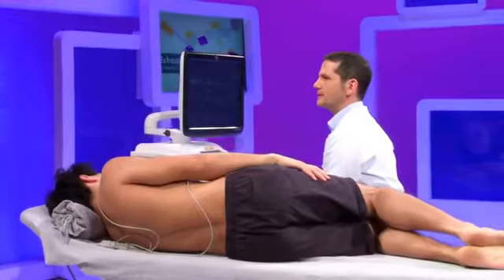I will talk to you today about the assessment of left ventricular diastolic function, a topic which is of great interest in clinical practice. The key point is that as we do not have a single parameter reliable enough to tell us everything about LV diastolic function, we need to do a comprehensive examination whereby, combining information provided by different techniques, we can get a thorough assessment of the level of LV diastolic function and of the filling pressures.